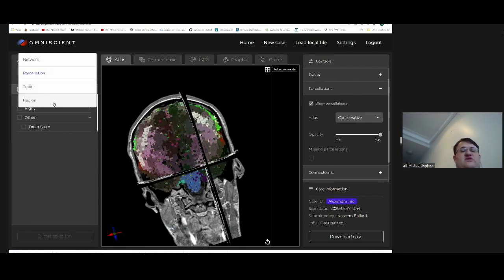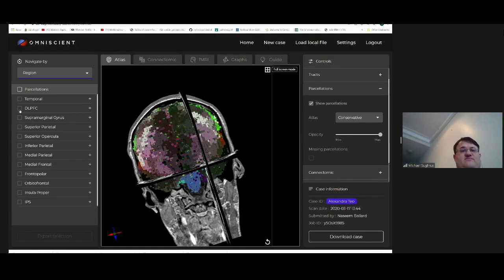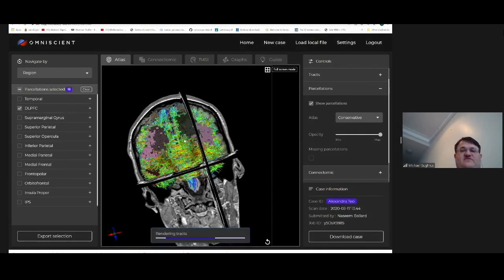Now, let's look at another methodology for subsetting. So here I'll just call the DLPFC.